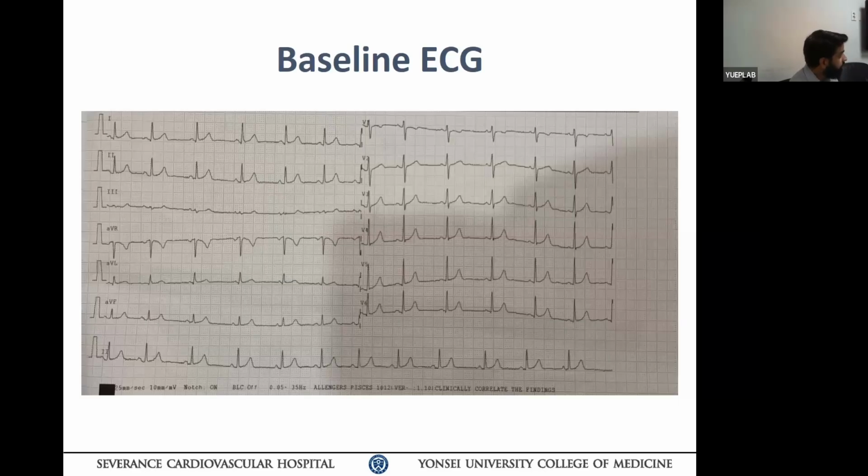The interval of the PR, QRS, QT is within normal range. Okay, copy. Just to pick up the abnormal finding.